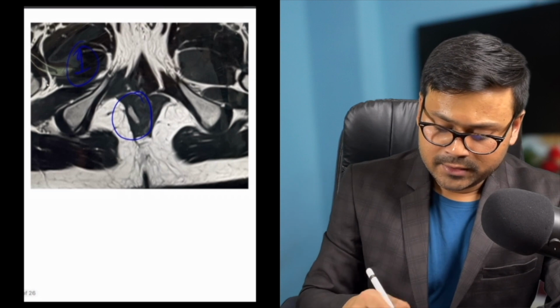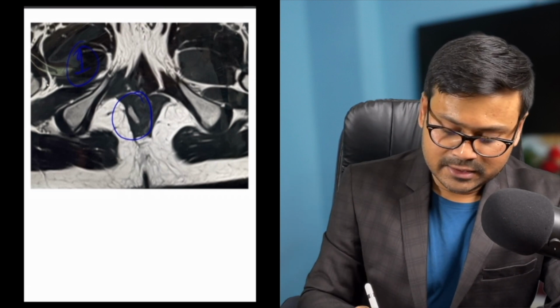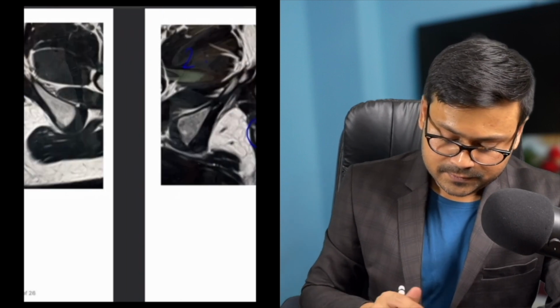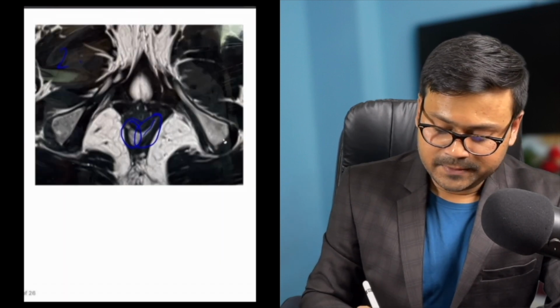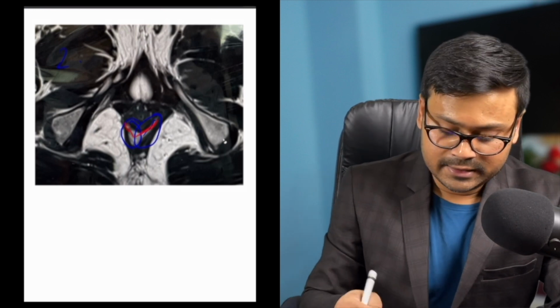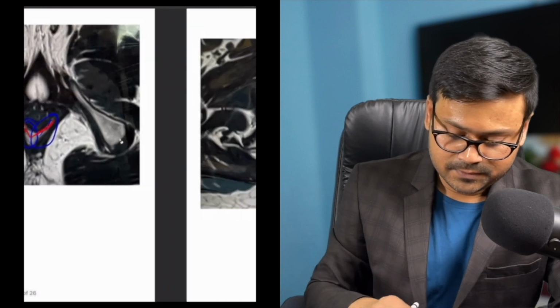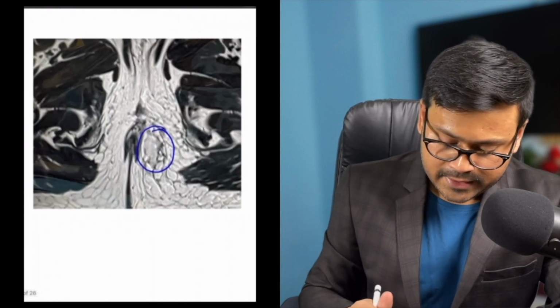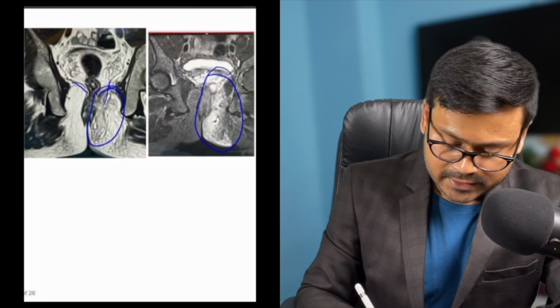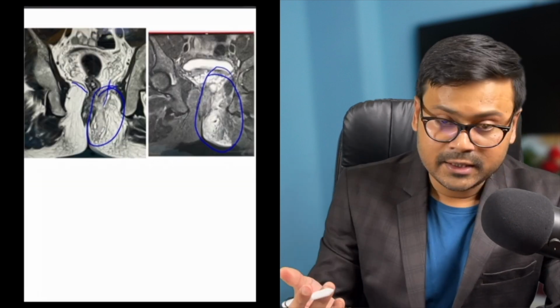I showed you the different types of the images. This is the active tract again, intersphincteric, simple. This is intersphincteric fistula, but ramification is present. See, two horns are present. So one is the main and another is the branching tract, and intersphincteric also. And next type, this is the big abscess formation, and it is crossing the levator ani.